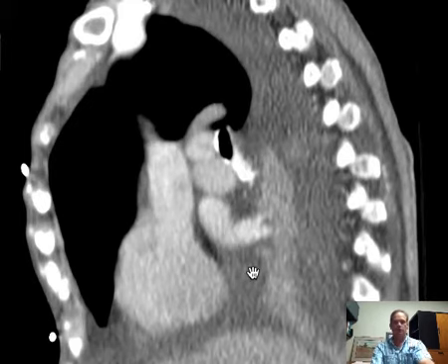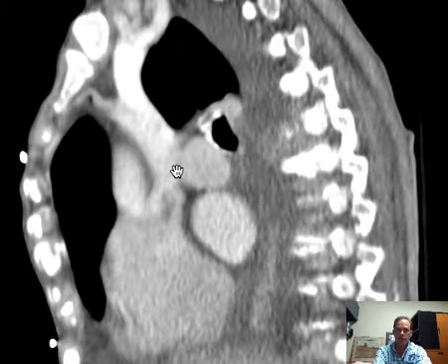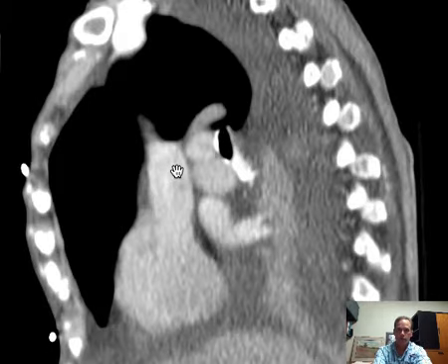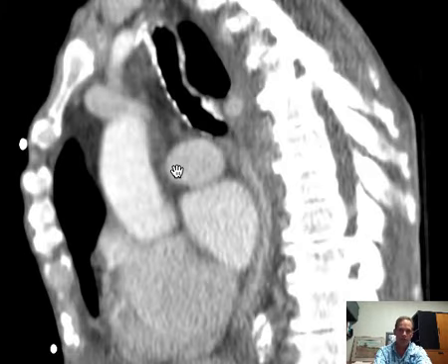All right. Well now, here's something I just stumbled upon. This is the heart, I'm pretty sure of that. And something is coursing up out of it, or to it. What might that be? We'll cover that in a moment.